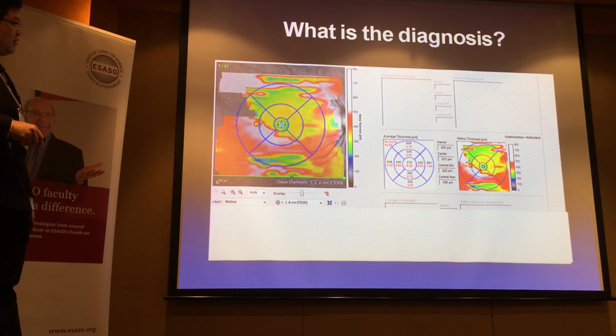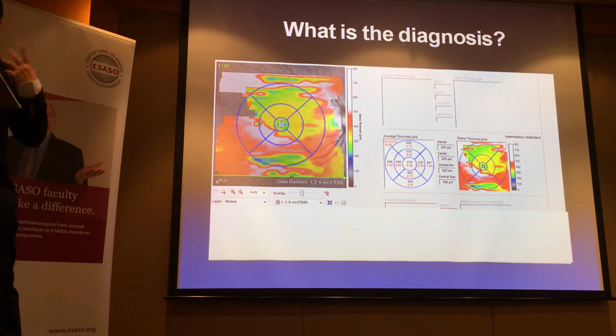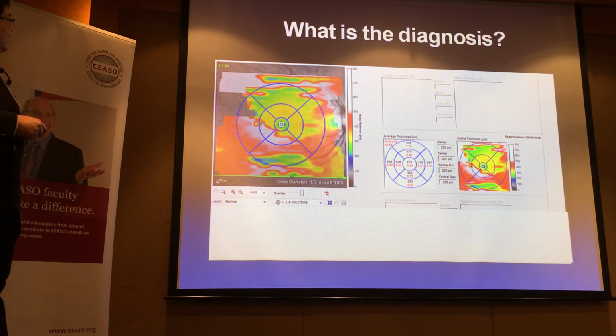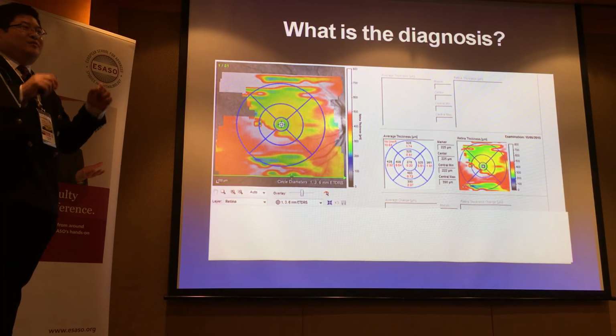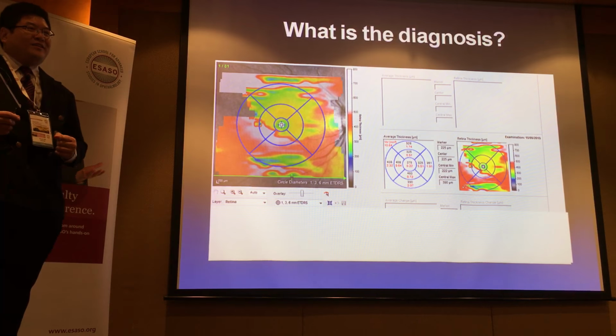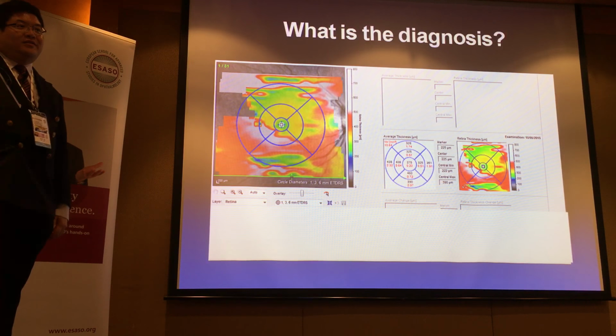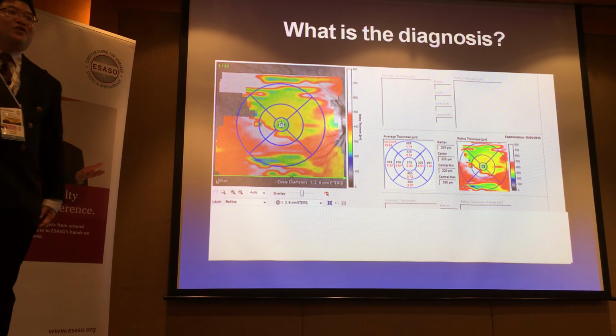In fact, this thickness map on the same machine would reflect the color as it were. The color is just like a heat map representation. So it depends on where the errors are. But one clue is when you see lines like this, unless you're taking some traction band that is perfectly horizontal, right? How often have we seen that? So it's usually because that's where the error is. So that's one of the indications.